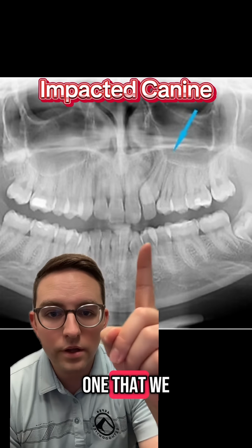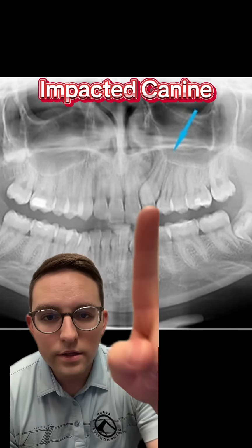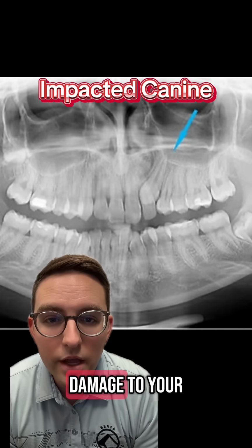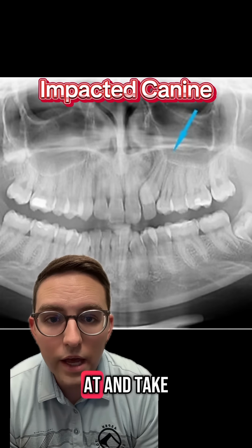So this is one that we call an impacted canine. You can see the arrow pointing to the tooth there. It's this tooth right there. So you can see it crossing over this other one. If you leave it there for too long, it might cause damage to your adult tooth, so that's something we want to look at and take care of.